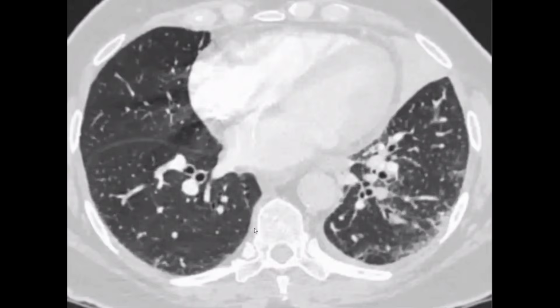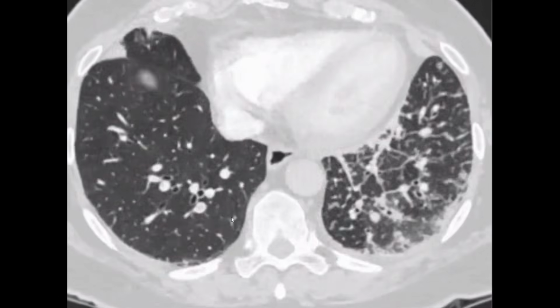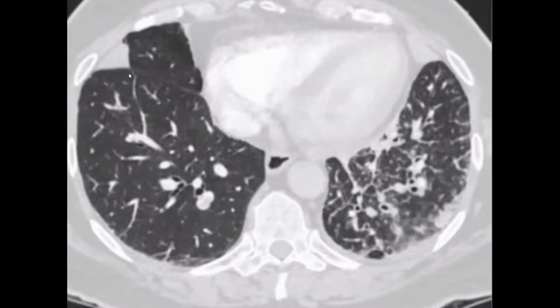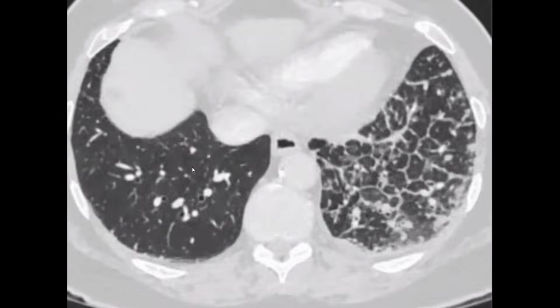Yes, it's subpleural, in the right one. I think it's consolidative changes, not like a consolidated mass. It's triangular, subpleural opacity, and I don't think there is some air bronchogram.